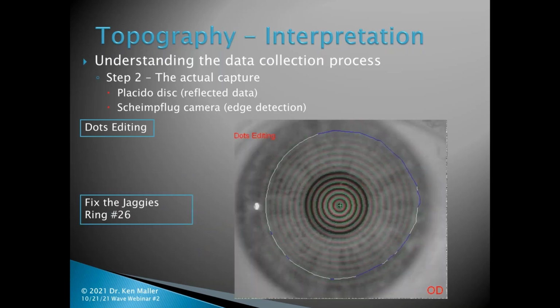On this ring, 26, you see I corrected that very, very large area that was going from about a quarter of the cornea over there. And in addition, I've corrected up these additional areas that had all kind of irregular data being displayed, all because of the fact that something was wrong with the original capture.